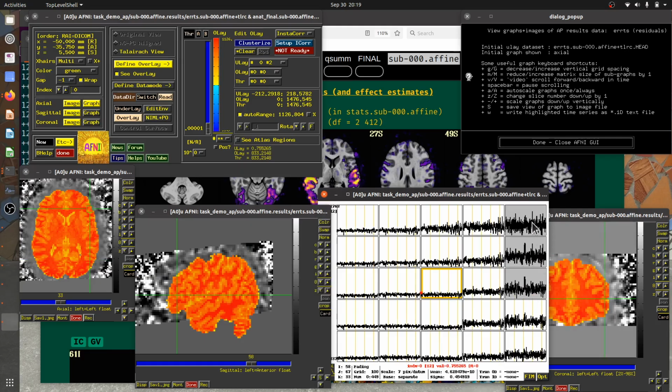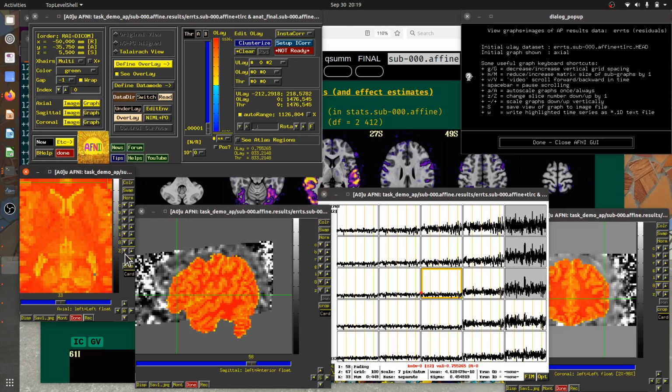The gray that you see here now appearing, if I just zoom in a little bit and pan to where this is, you can see that the edge of my box that I'm looking at, of the graph view selector here, includes a little bit that is, now that I have an overlay, I can see that some of this is inside where my overlay is non-zero and some of it is outside, and that's what this gray background reflects.